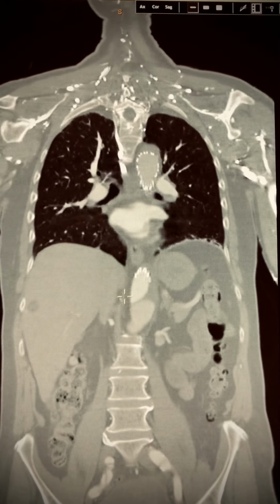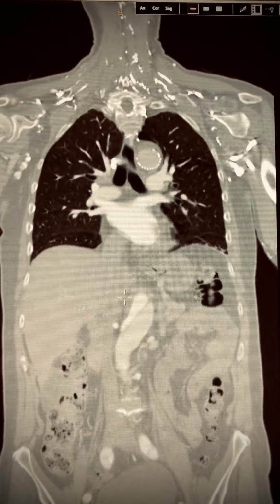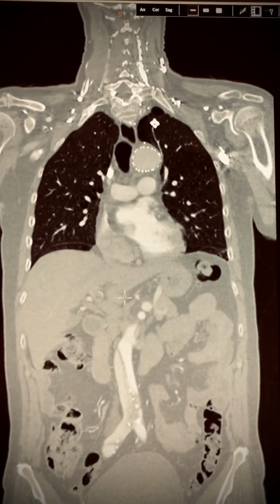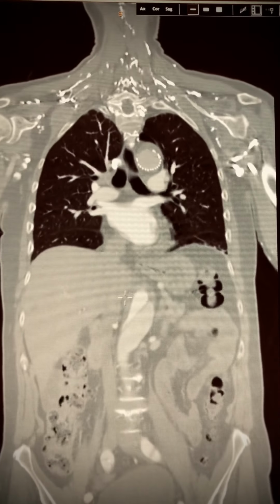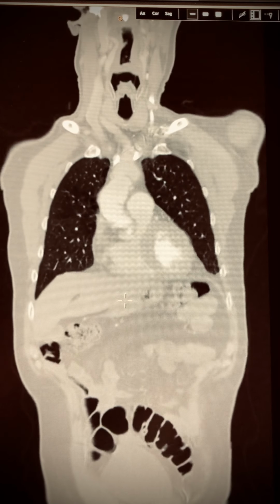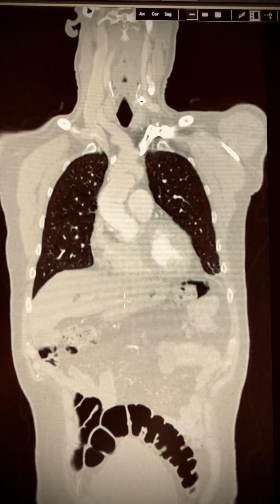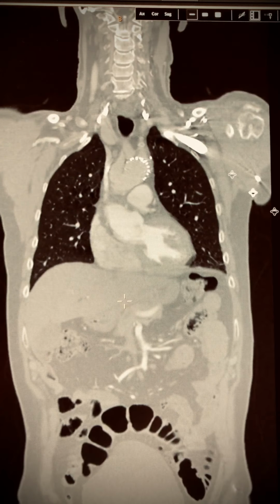At first, the patient will get a conduit or a bypass procedure to secure the blood supply to the left arm, and in this case you can see that there is a bypass vessel at this location here from the carotid to the subclavian, like that.